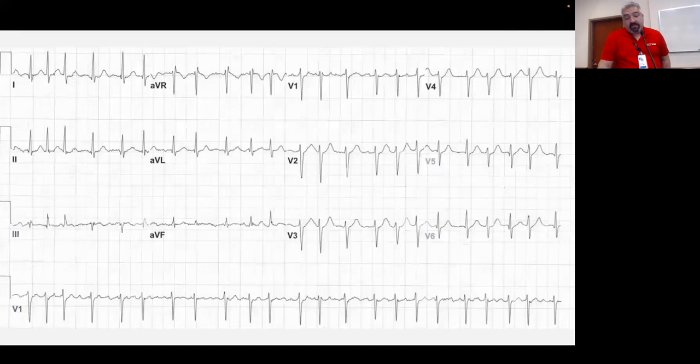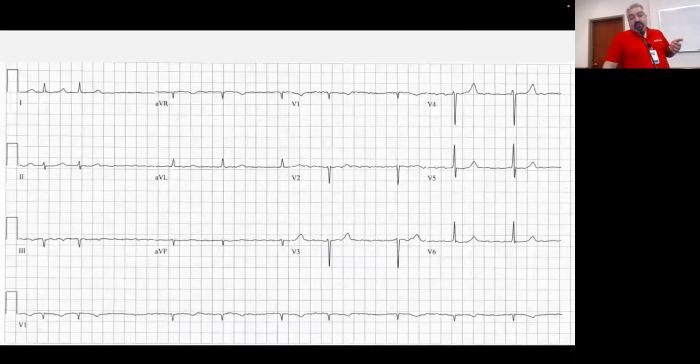Now AFib, you start with something like this. This is what I would call a coarse AFib, because sometimes you could be convinced that maybe that's a P wave before this one, or maybe that's a P wave before this one, because there aren't as many foci firing in the atria. And so sometimes, based on the timing, you're able to convince yourself you see an individual P wave. That's because they're not firing enough that they're completely stacked on top of each other and indiscernible.